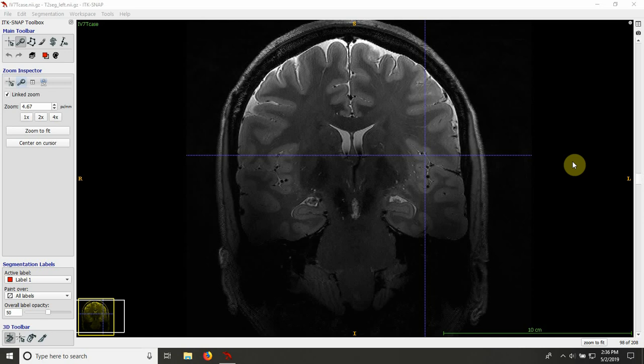If you haven't done so already, I would recommend that you first watch my other tutorials on whole hippocampal anatomy and hippocampal subfield anatomy. And before I get started, I want to point out that there are actually quite a large number of different segmentation protocols. So what I'll try to do today is show you a more general segmentation and point out where the differences are between the segmentation protocols.